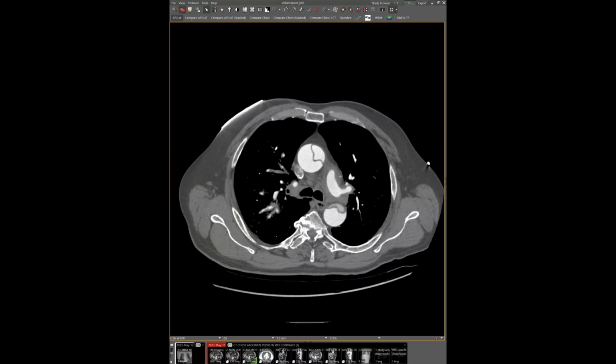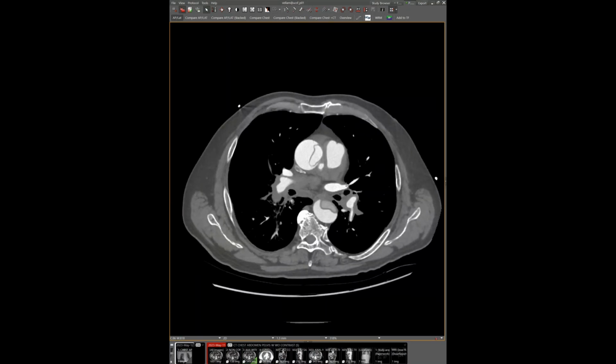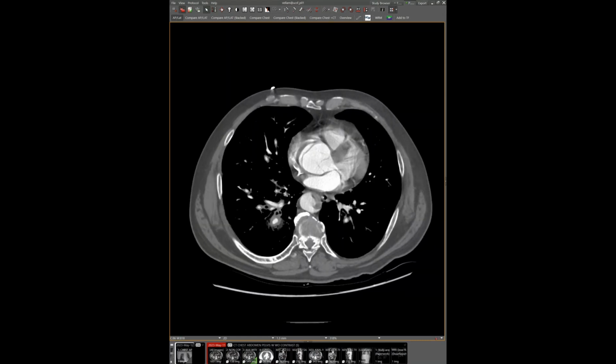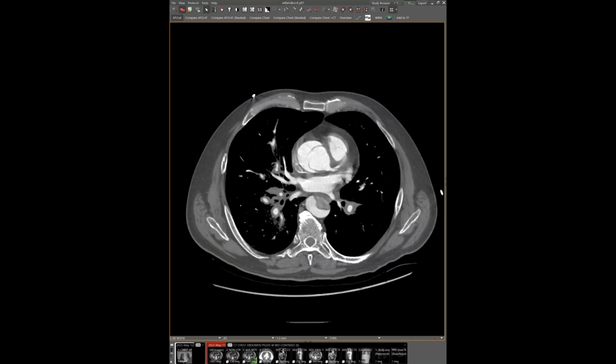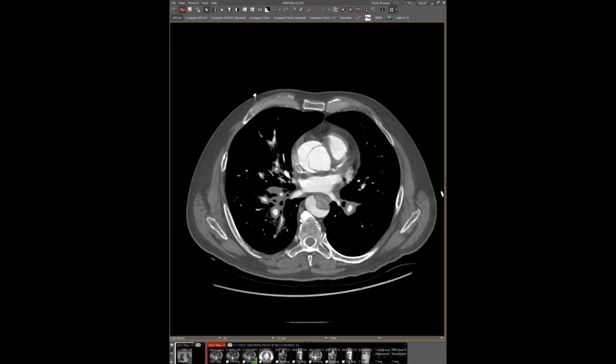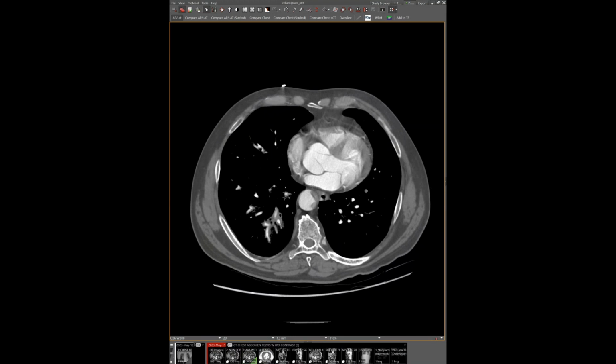Extension of blood along the shared adventitial sheath between the aorta and the main pulmonary artery. We can see it on both sides. And interestingly, you can see it surrounding all of the pulmonary arteries, but not the pulmonary veins, because obviously the pulmonary veins don't share that same adventitial sheath. That is one of the more extensive ones I've seen going out that far. I agree, really impressive.